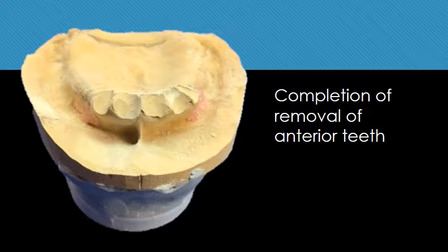Now all of the anteriors have been removed, giving us a replication of the interseptal bone and the undercut existing. We're now ready to modify the stone in order to be prepared for the completion of the setup.